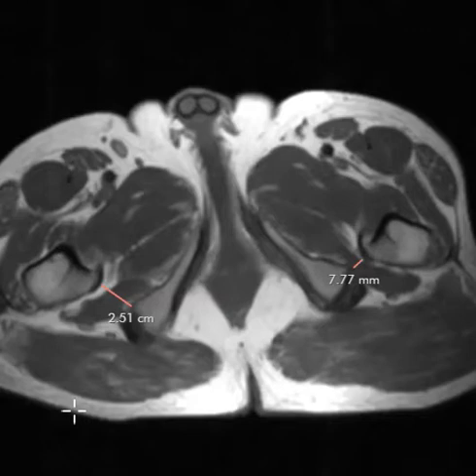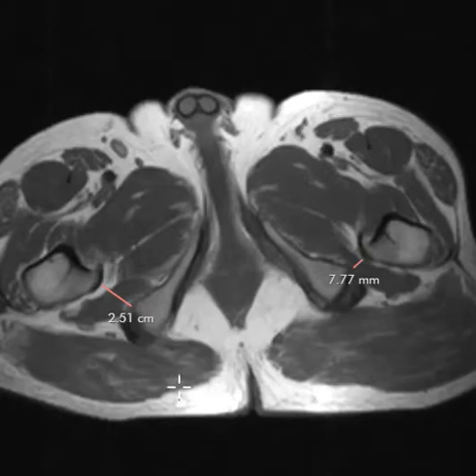This is a 44-year-old male who complained of right-sided hip pain for several years. It was worse when he tried to lift his knee towards his chest. He felt some pain and limited mobility, and this is a finding that is just incidental. He had no pain on the left side, but he did have an asymmetry.